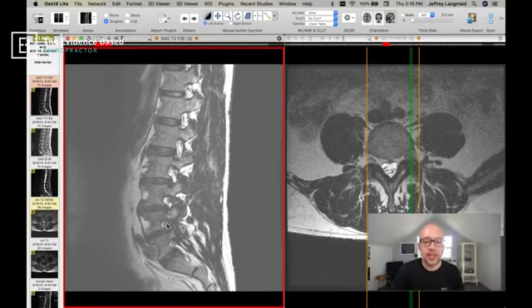Every different level that you see here, every different pathway where a nerve travels out, is like a different power line going to your neighborhood. They all go to different houses. So you could identify, based upon where the power line is going to go, what house it may affect. And we know, we call that dermatome.